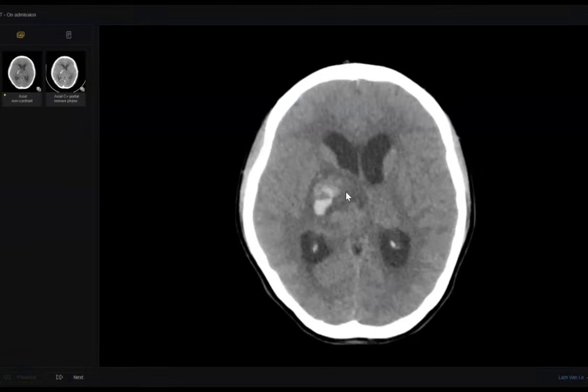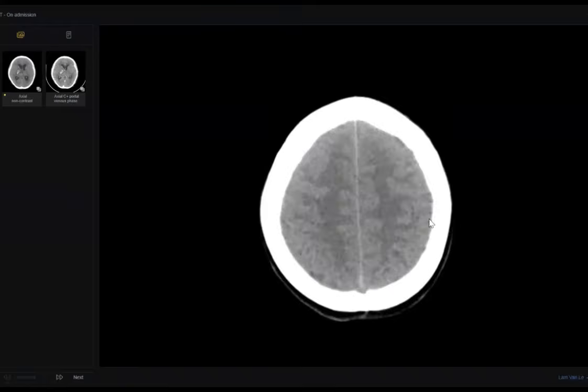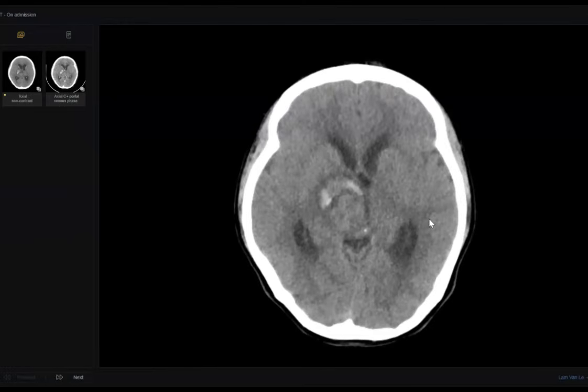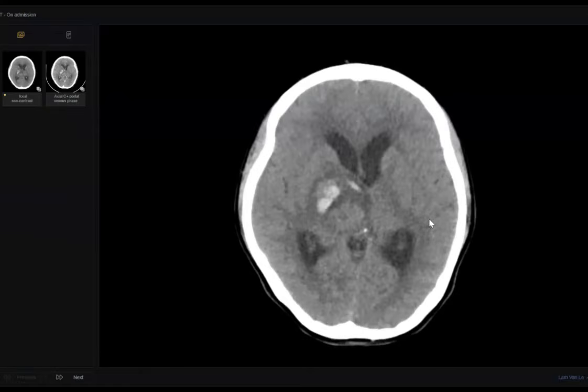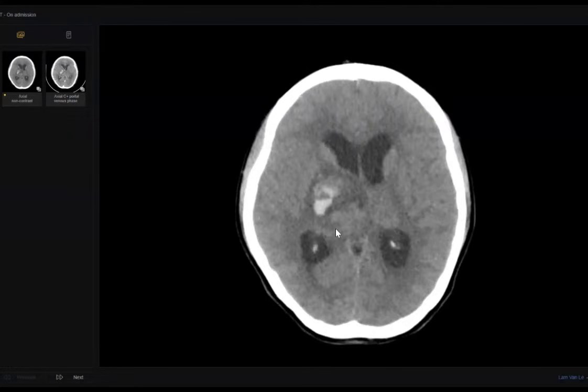Very common sight. But I told you in the last case, look up and down, and search for two things: curvilinear structures, and then any mass lesion. Here it is really very difficult. I excuse our colleague, because it is very difficult, but you should compare the diseased side with the contralateral side. See here the thalamus, almost oval in shape, but here there is something rounded with an irregular border.